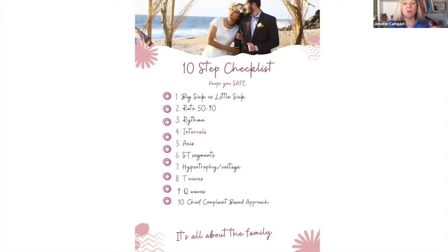Now, step 8 is where you're going to look at your T waves, looking to make sure that they all point up, except for in aVR and V1, where they should be inverted. Then scanning the layout for any Q waves. Are they present? And if so, are they more than a third the height of the R wave? If they are, they're most likely pathologic.